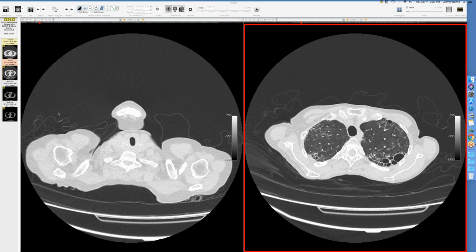But a bronchiole can't get this big. Maybe it's an emphysematous space that has fibrosis in the walls. But you see that in the smokers with IPF that have bad emphysema. They get those really thick cystic spaces, often posteriorly. In the pathology, sometimes they refer to that as airspace expansion with fibrosis, where you get collagen in the walls of what's left of the alveoli, and then this airspace expansion, which is what we call emphysema.